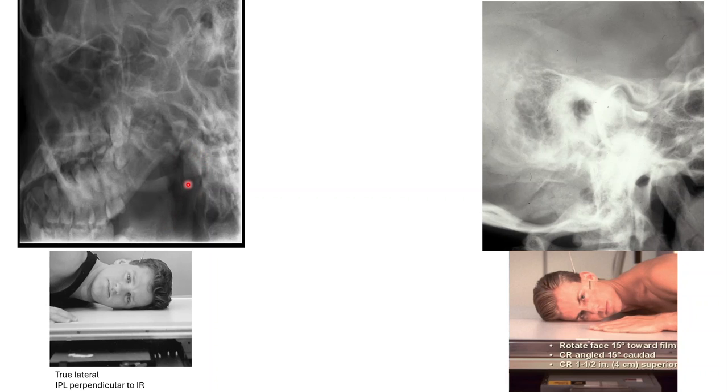The condyle of interest is directly in line with that condyle because the patient was placed in a true lateral position. So there's no rotation. So here we can see the condyle of interest seated in the temporomandibular fossa here. And this is a closed mouth TMJ Schuller position.